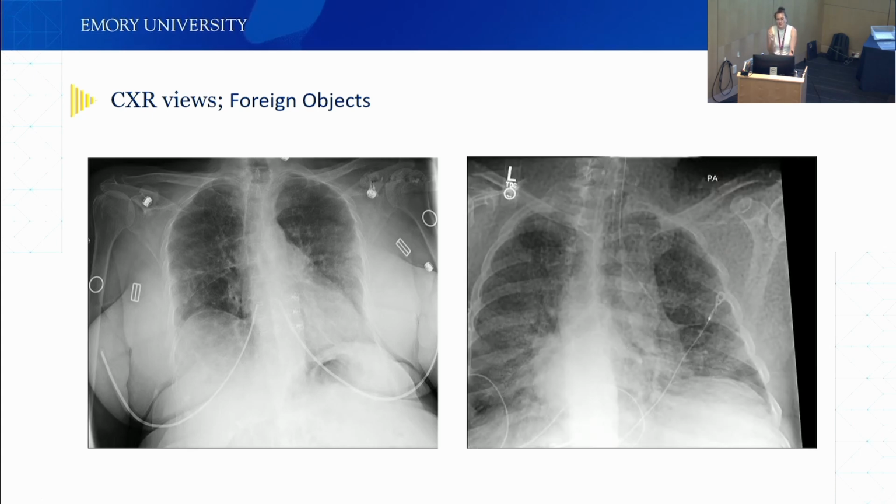This one, for me, threw me for a loop. So we take point of care pictures, where we take actual photographs of patients while they do the x-ray, so you can look back and see how the patient looked and how they were positioned in bed. When I saw this, it took me a little while to figure out, so I'm curious if anybody has any ideas of what this is. Close. It's a blanket. It's not even a heating or a cooling blanket. This is just a normal waffle blanket that they kept over the patient during the x-ray.